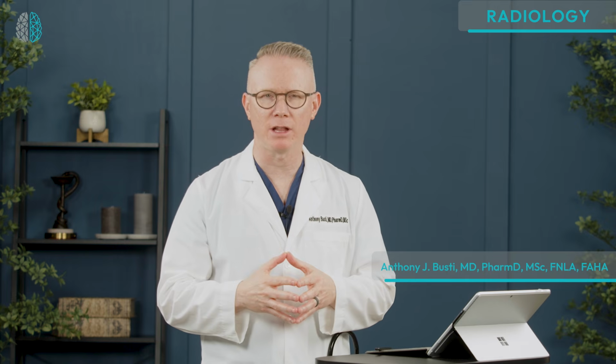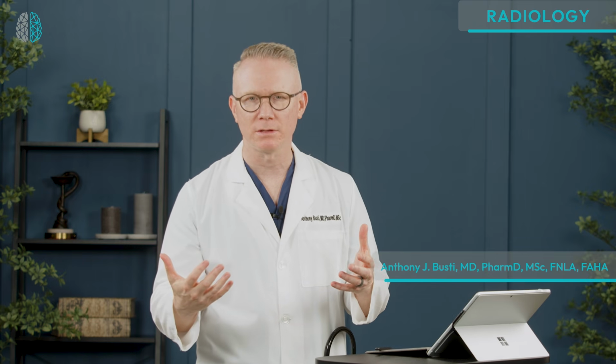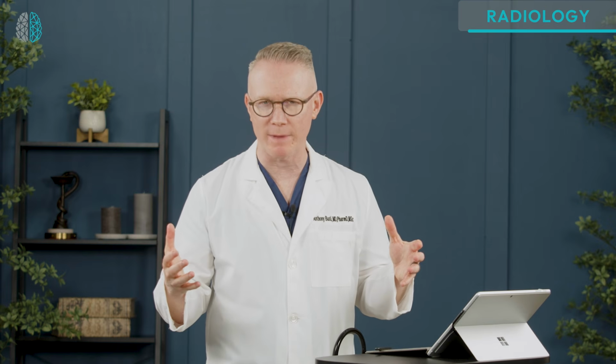All right, so why does this matter? I'm focused on it a lot here about this projection. Well, because it relates to the position and the posture of the patient. And so when you are looking at an AP film, and depending on what your patient's history is or the reason why they're there seeing you or you're managing them, one of the things that you might be concerned about is heart failure or cardiomegaly.